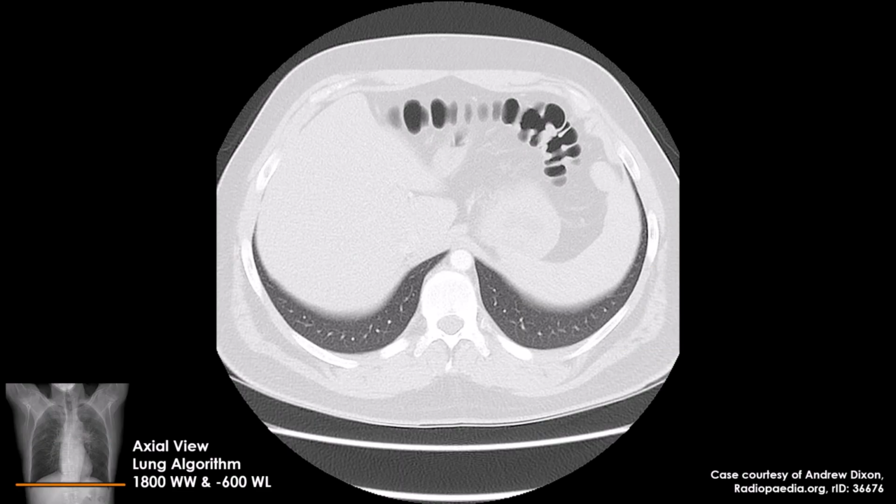One more slice in the axial plane. In this CT axial view of the lower thorax, the lungs might look different than expected. We can see the right and left lungs, but only on the posterior side of the image. That's because the lungs extend much lower on the posterior side compared to the anterior side of the body. That means that at this slice position, we are seeing a portion of the thoracic cavity, but also a large portion of the abdominal cavity.